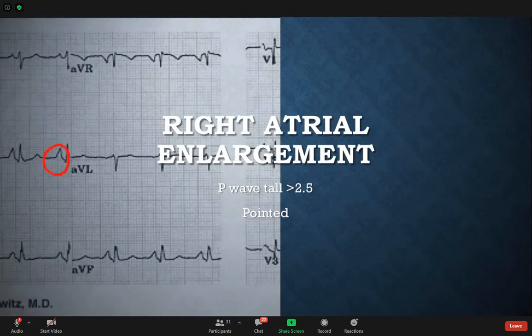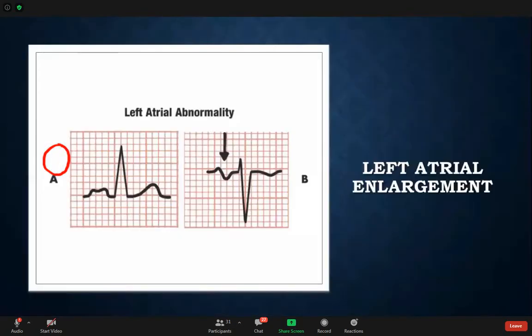I'm going to give you an example, you're going to come across an example and I'll tell you what's wrong with this. Then this P wave represents what disease? I expect there might be an echo. The P wave, which represents which disease? This is why I want you to see.